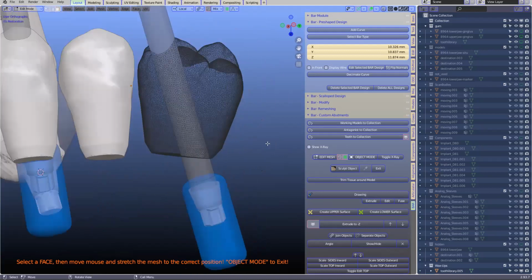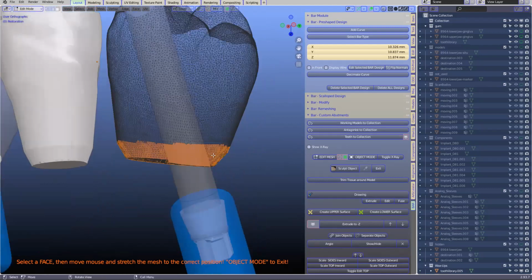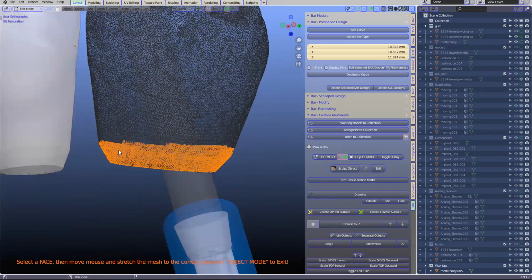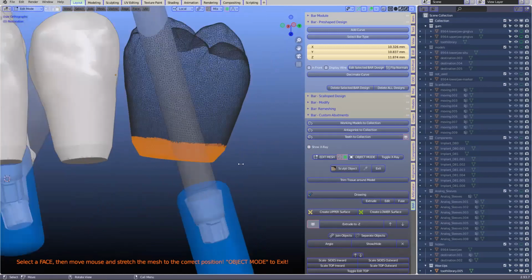Now here, one word of warning: when you go to edit mesh, you can see all the way through this wire, but we are not in transparent mode, because you'll notice I'm only selecting the front. Click the X-ray one, because we want to select all of them like this. And you've got to be in proportional editing mode. Isn't that correct, Michael?